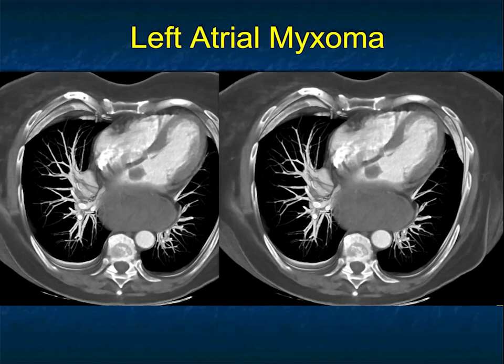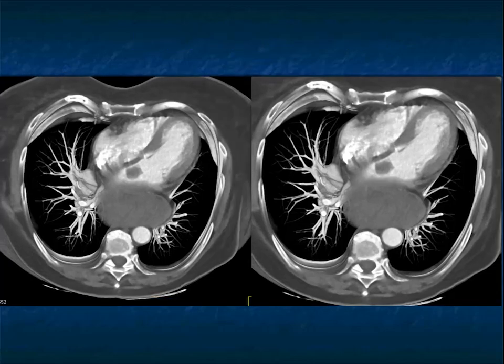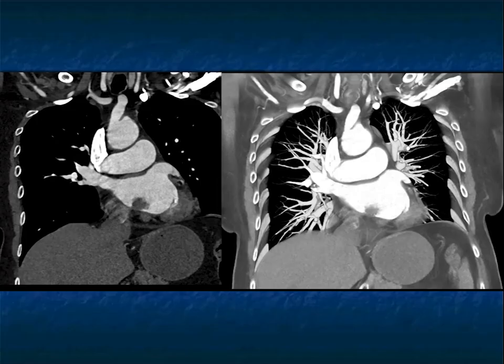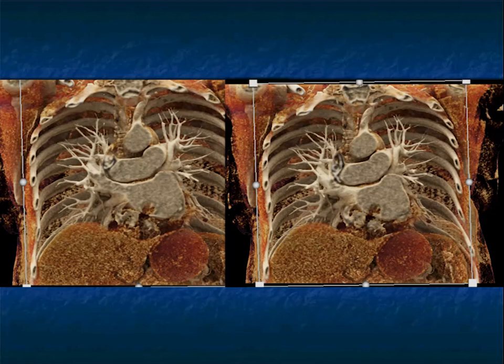Another example, here's a patient with a large hiatal hernia, but you see evidence of an atrial myxoma right there. This is obviously much smaller than the prior case. This is a bit over a centimeter, but location, perfectly positioned, relatively smooth margins, classic again for left atrial myxoma.